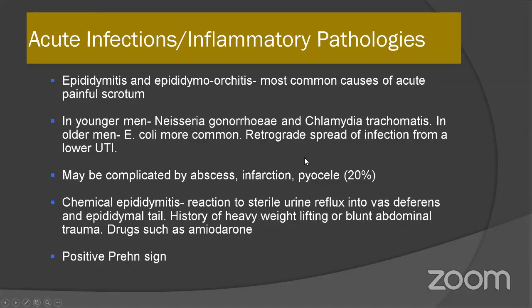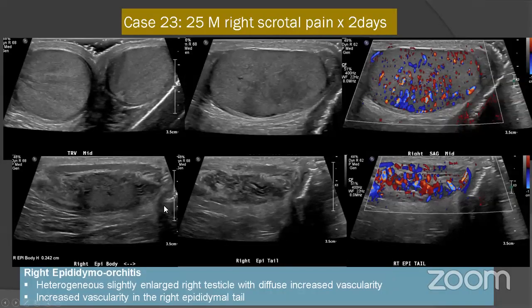So when you're suspecting an epididymitis, don't forget to look at the epididymal tail, and they can be complicated by either abscess, infarction, or a pyocele. They may not be infectious. They could also be chemical-induced, drug-induced, or post-trauma related.